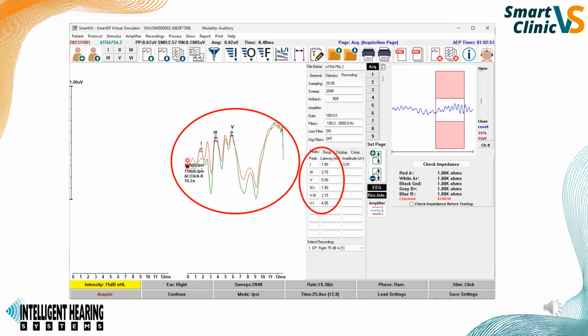a window will pop out, and if you click on the Peak tab, you will be able to see the 1-3-5, the 1-3, the 3-5, and the 1-5 latency measurements based on the waves that you marked.